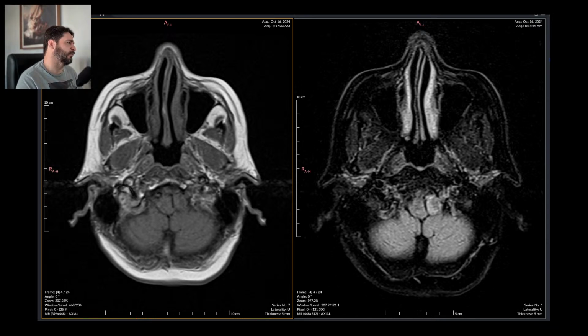It says brain bulb, but it isn't. It's medulla oblongata. I don't know how to call it in proper English, just in the Latin. It's probably medulla oblongata.